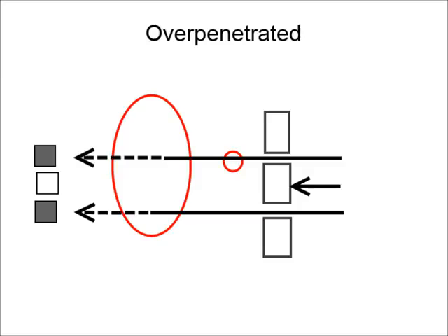In an over-penetrated film, the powerful X-rays go straight through the small, soft pulmonary vessels as if they weren't even there, making them invisible, while the heart appears darker than it should. 4. Look at the big picture.